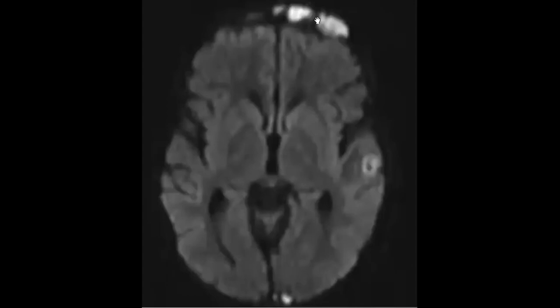Yeah, so these lesions have restriction. So this now gives you the impression that this patient has, as the final diagnosis, a left temporal abscess with venous sinus thrombosis and left mastoiditis. The most important thing for FRCR is to mention that you make an urgent referral to the pediatric neurology and neurosurgical teams.